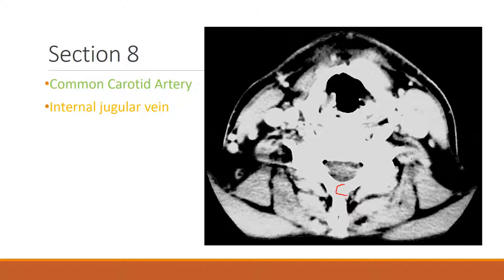All right, so for now we're going to focus on looking at arteries and veins and some heart features. Now, you've got to kind of train your eye when you're looking at CT scans. The patient was given a contrast medium. They ingested a fluid, in other words. And so any liquidy areas of their body will fluoresce a bright white. Any air-filled areas will remain black. So for looking for blood vessels, you want to look for the color white because that fluid will fluoresce a bright white in a CT scan.